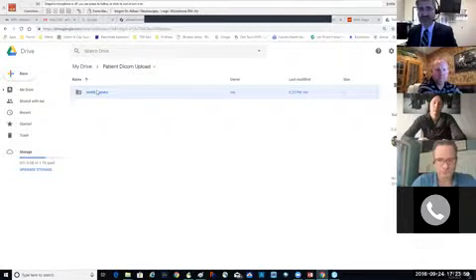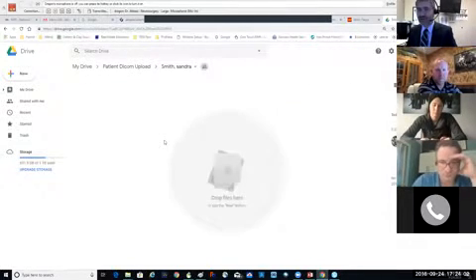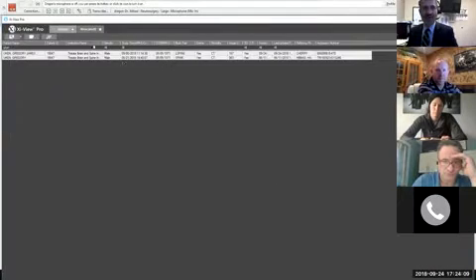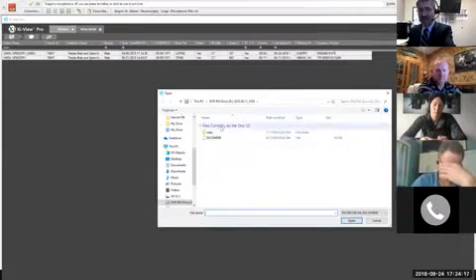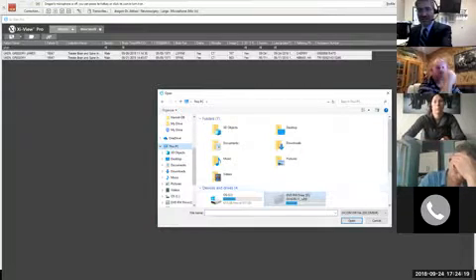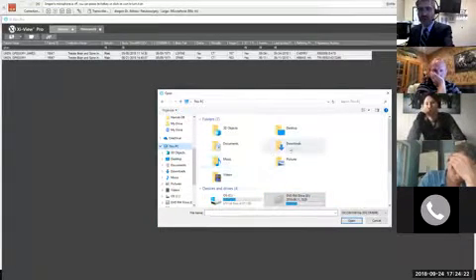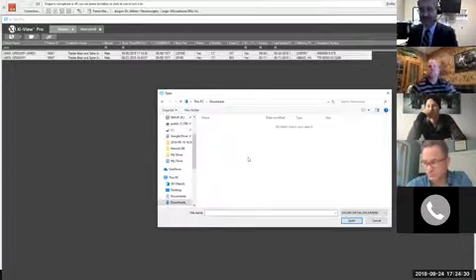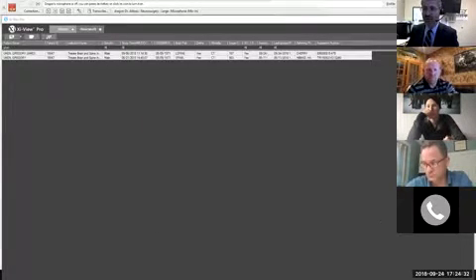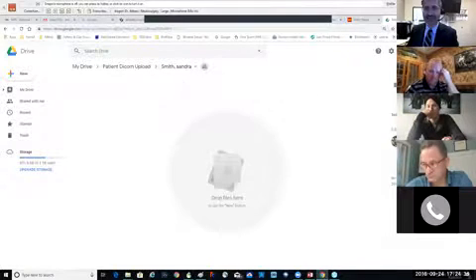I can go in this directory and download to wherever I want, and then on the XIView, instead of going to my DVD drive, I can go to downloads where the downloaded files are. I can upload directly to 7Medical from the downloads.